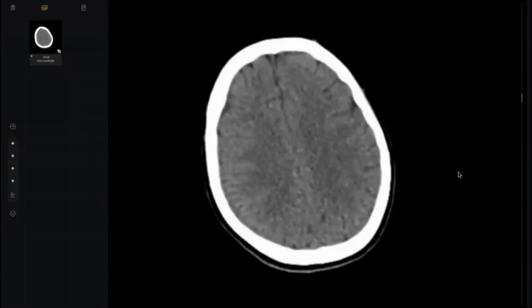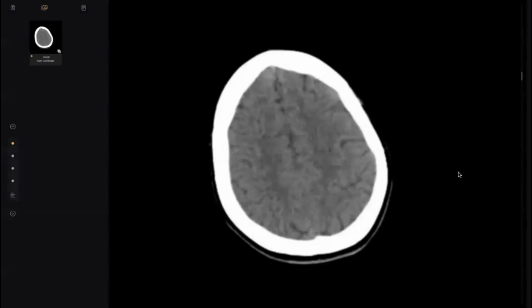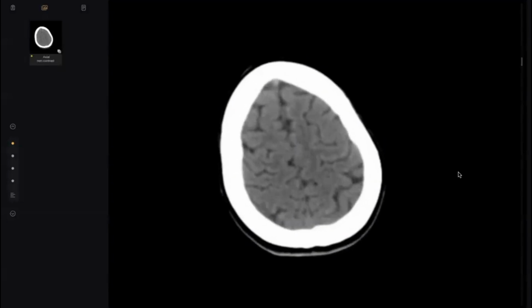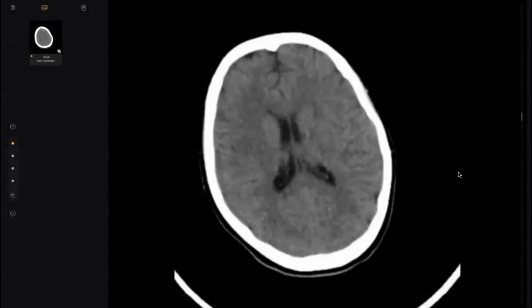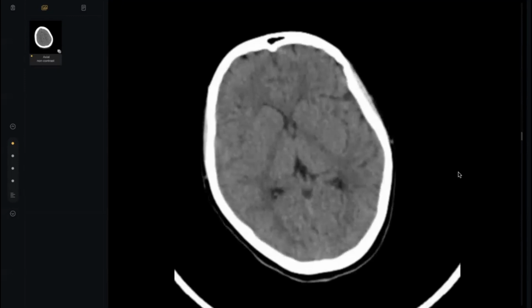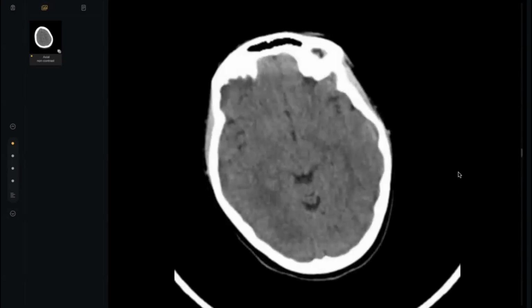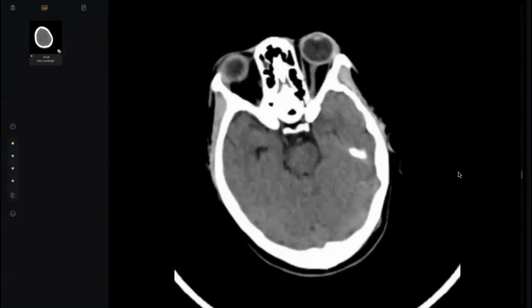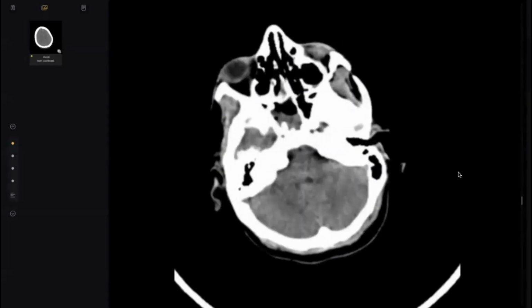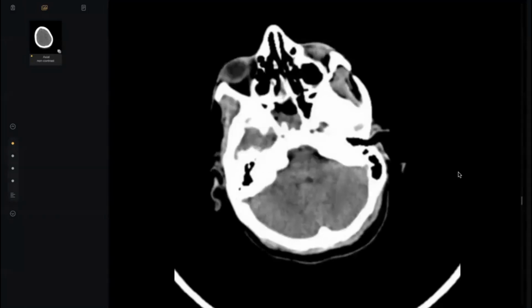He brings you a patient with a very significant complaint, and you are not sure about this CT. You can't detect anything, so ask for MRI. Despite that you can consider that there is some edema, really very subtle signs here, very subtle. Ask for MRI. Thank you, doctor, so much.